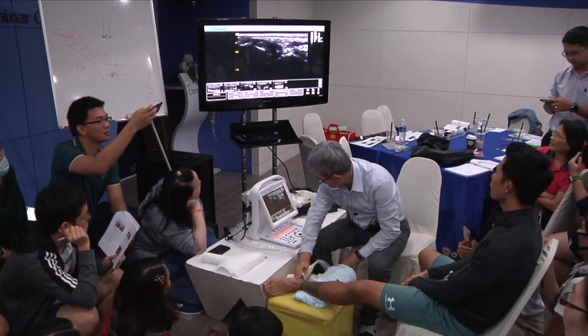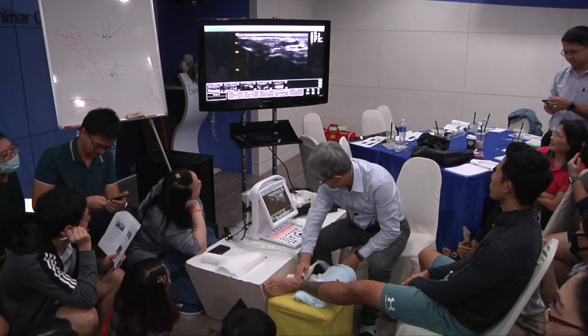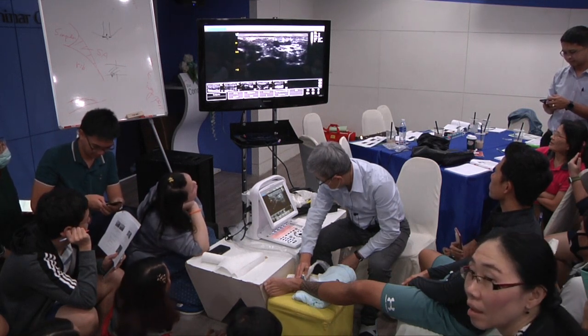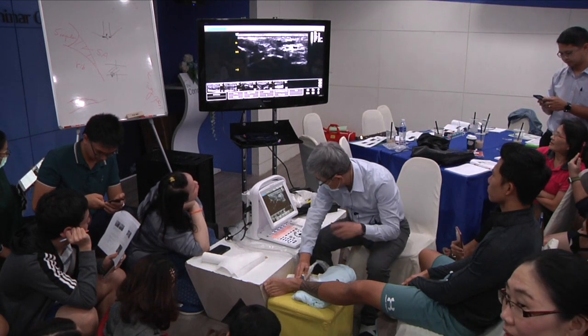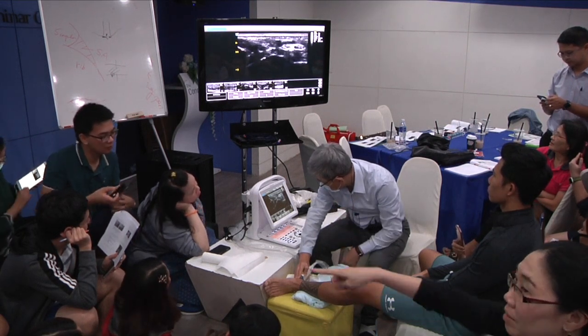So why I'm sure this is the flexor hallucis tendons. Can you? Yeah, good.